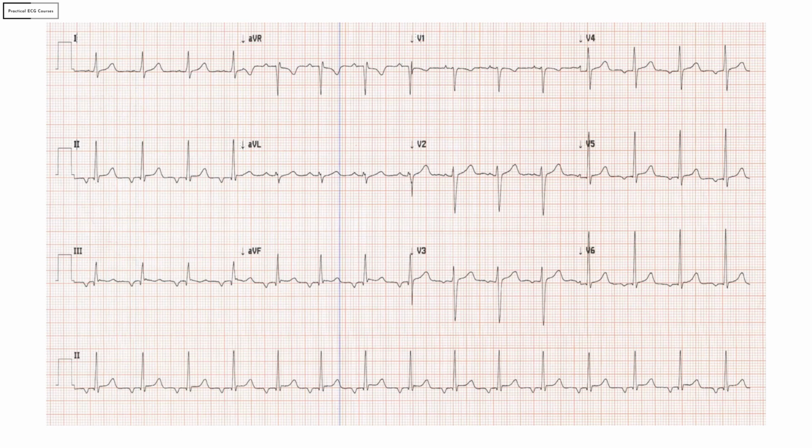A 50-year-old man comes to the ED with chest pain, and this is his ECG. Pause the video, have a good look at the ECG, and come to your diagnosis. I hope you have come to a conclusion, and if not, good, because I can show you how to use deductive analysis to interpret unfamiliar ECG patterns.